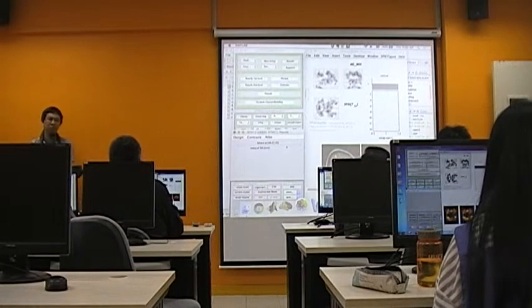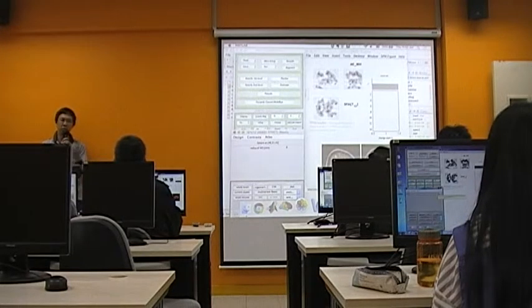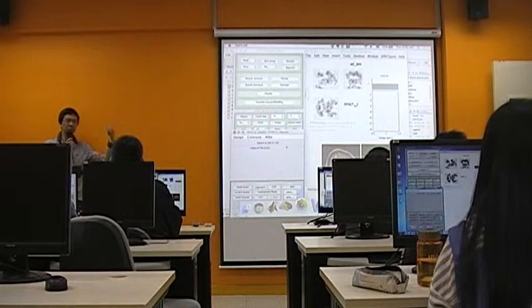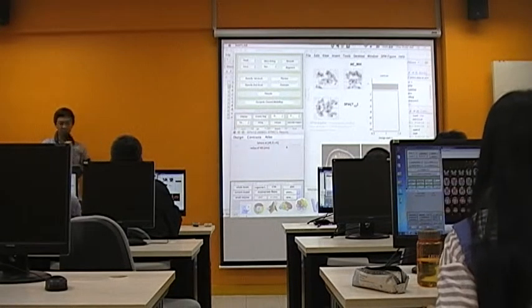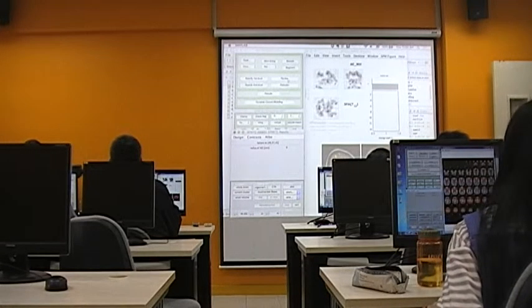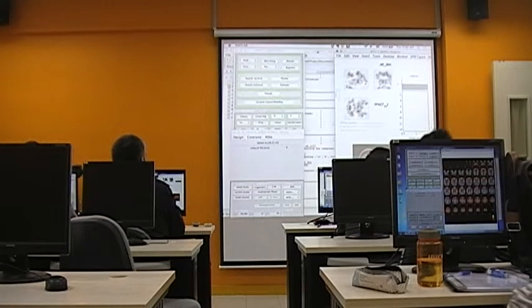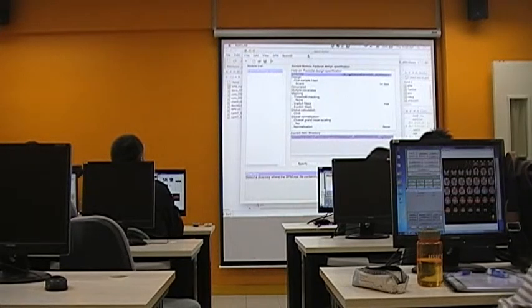If you have two groups of subjects, let's say one control group and the other a clinical group, you ask them to perform some kind of functional task, you define the contrast at the first level, and you simply bring the contrast images to the second level. So you are comparing the two groups. It's not that difficult. But I want to quickly show you what you could do with what we call the flexible factorial design before we finish.